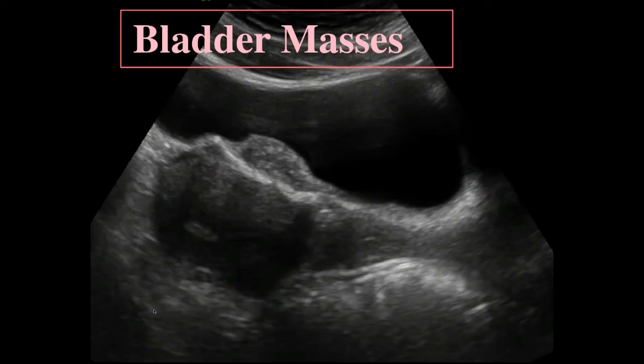Now, I want to spend a little time on bladder masses because we do look at the bladder when we do pelvic floor exams, just to see if there's anything there. I call this the forgotten organ because we often look through it, not at it or in it. This is a thickening of the bladder wall. That's right in front of the uterus right here. This is endometriosis of the bladder wall. This is typical. It's fusiform. It's not fungating. It's got a smooth outer wall. It's really in the wall of the bladder, not in the mucosa of the bladder.